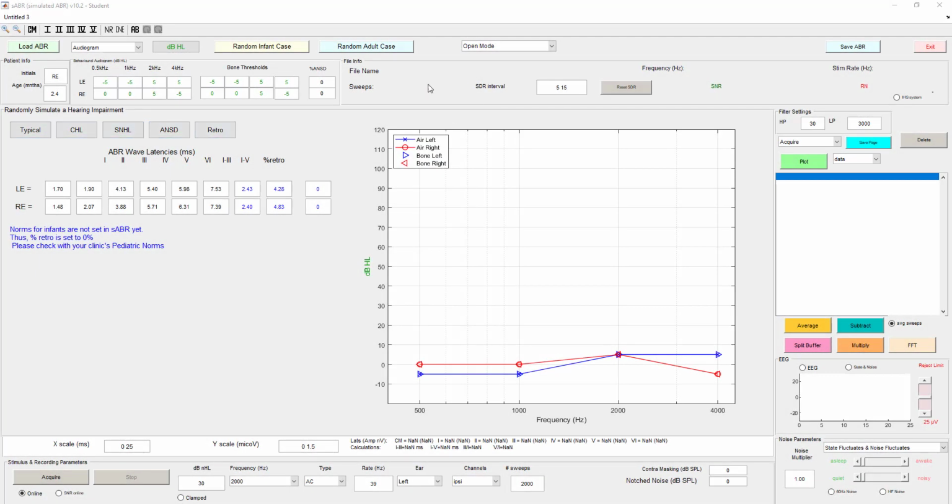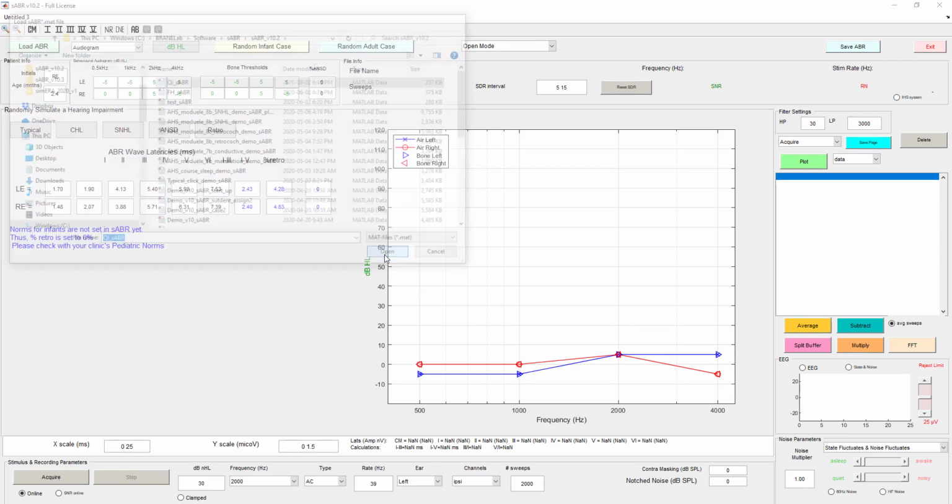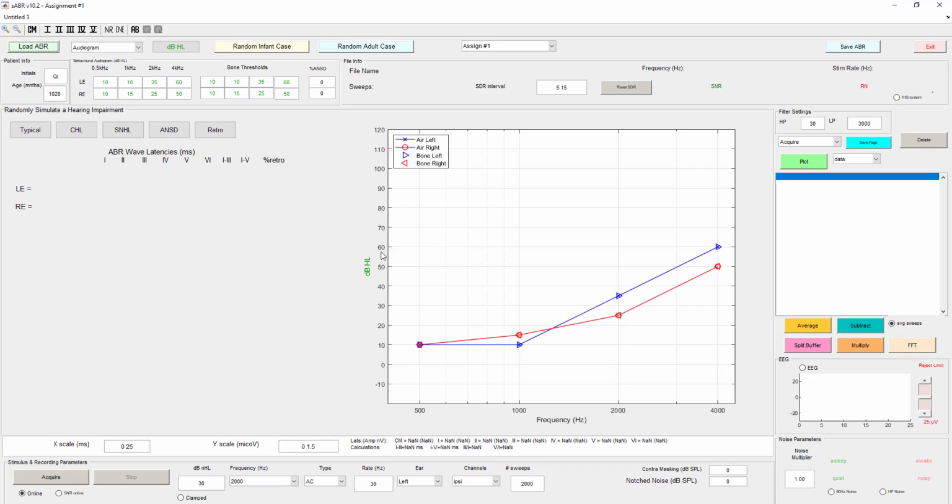Okay, now I'm back in the student version. As you can see, it says student up here, and we do not have the instructor view button there. So once you've distributed that case file that we created, you distribute that to each of your students. They would then save it on their computers and then go ahead and load it. So we'll just go ahead and do that here as if we were a student. Click on load, and we would load that case. And then if we click on open, the case opens up.